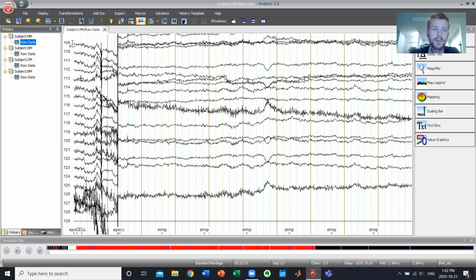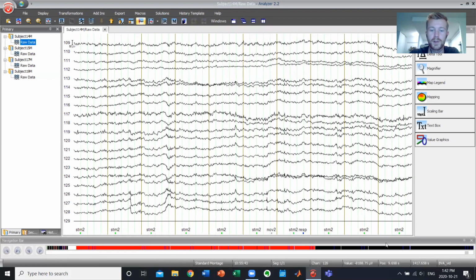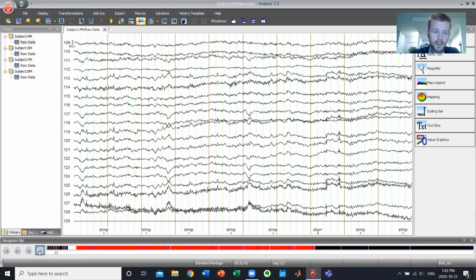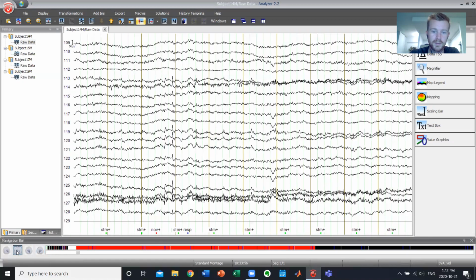We have the channels coming vertically here. And if I move across here at the bottom, then we can see all of this data. You'll see that this data started right here at 10:32 and it finishes at around 10:55. So about 22 minutes, that's perfect. So this is in fact our data. Now, when we want to shift across from right to left in this data, we can use either of these 2 buttons. There's a coarse tune and a fine tune navigation. So I can click, click, click. This will move all across my data. I can look for messy, noisy channels, whatnot. And this is going to be an even finer tune.